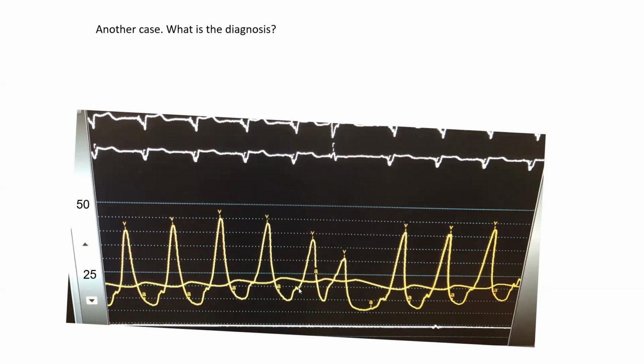But you can see it. This is an A wave here. This is an A wave here. An A that occurs after the P. It starts after the start of the P wave. You see it here. Okay?